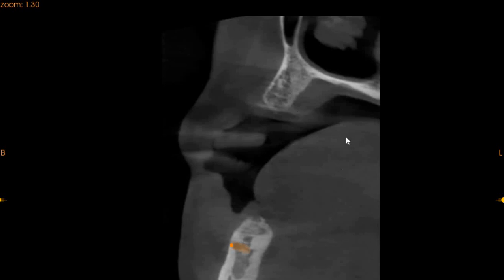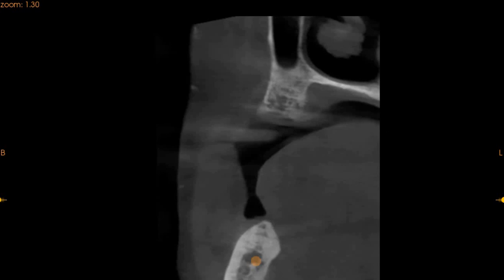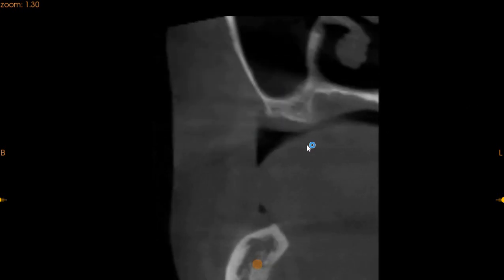This is D3 quality of the bone because we have thin cortical plate, but we have healthy cancellous bone. Moving to the premolar region, we also have sufficient bone in this region. Moving to the molar region, we do see atrophy of the ridge. The ridge height is not very significant. We've got approximately 3 millimeters of ridge height, and a sinus lift procedure will need to be performed if any implants are to be placed in the molar region.